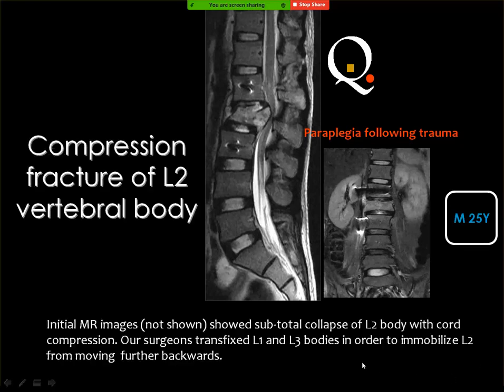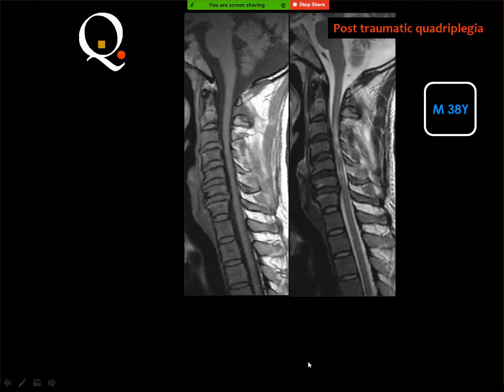And I emphasize this fact many times in the lectures, that bone marrow edema of whatever etiology will enhance with contrast. Degenerative bone marrow edema, traumatic bone marrow edema, neoplastic bone marrow edema, inflammatory bone marrow edema, all these types can enhance with contrast.